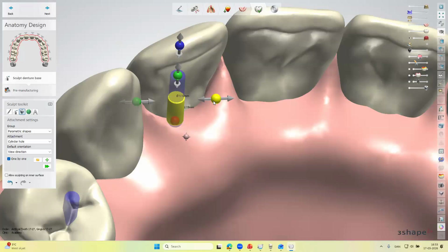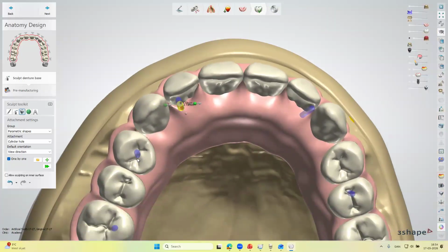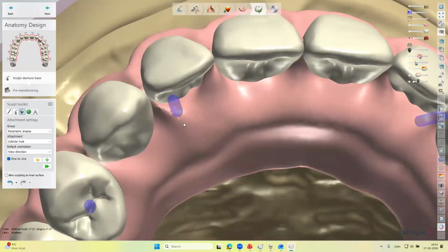I would say that 1 millimeter tool will not, or the CAM software will not allow 1 millimeter tool to access this hole and mill it. If you have access to a smaller drills, they might be able to go through this element. So click apply.